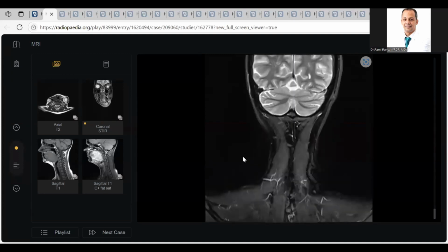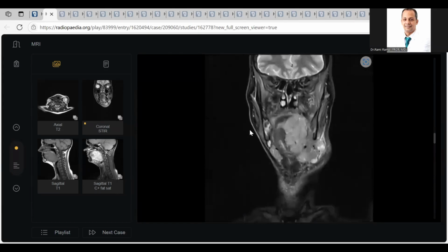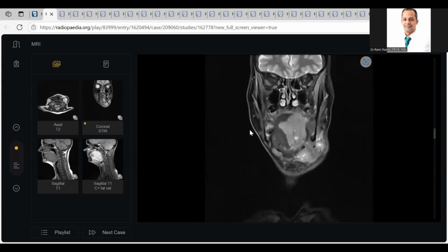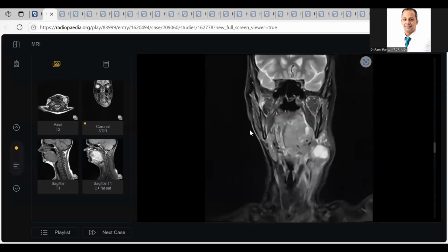We must exclude something very important because it will help the surgeon to take the correct decision. Contralateral involvement and involvement of the posterior aspect of the tongue. What extension else? Leave the mouse. Look here.